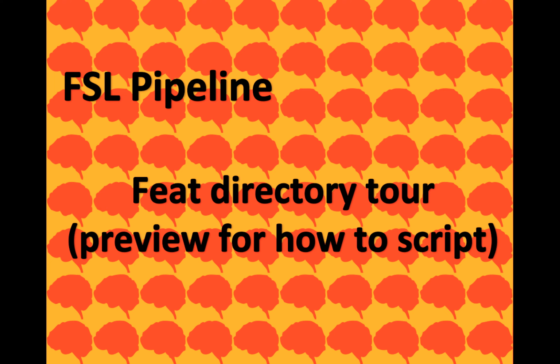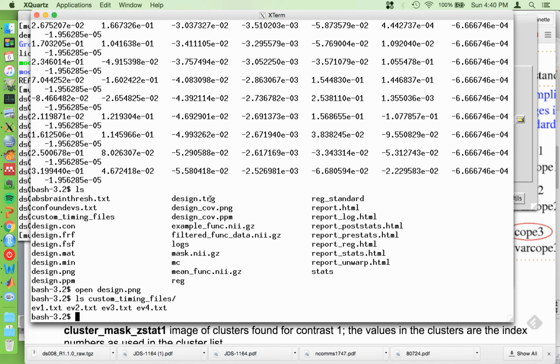Oh, and I skipped this. This is a directory, custom timing files. It has within it copies of your EVs. These are the 3 column onset files that you input. There's just a copy of them here, which is great. Moving along, there's another PNG, which is helpful for assessing collinearity.